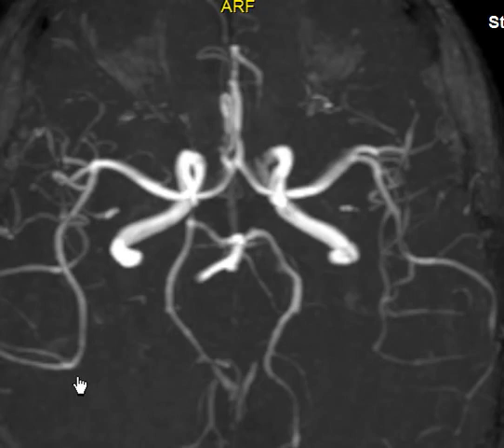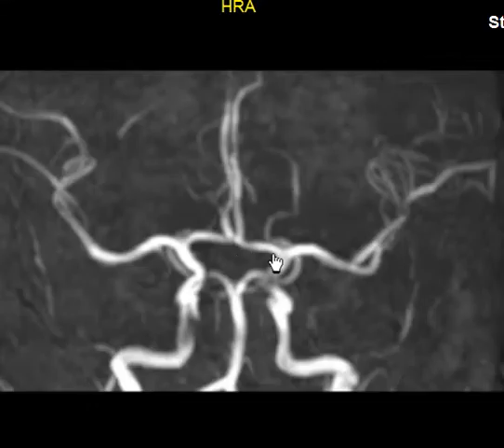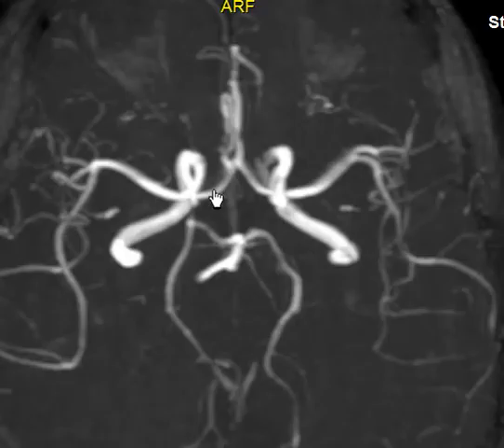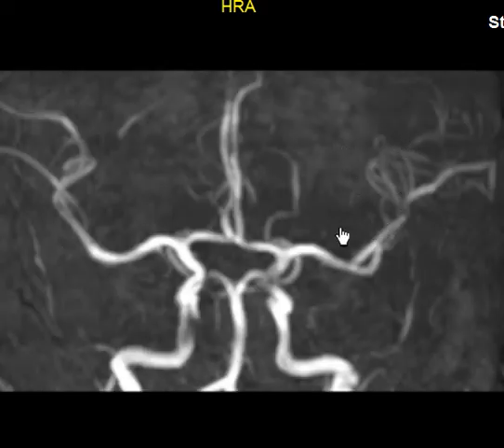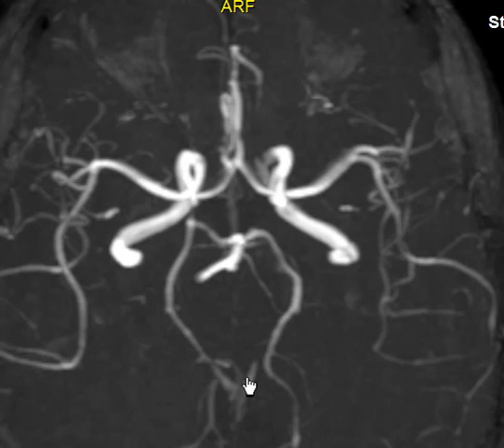Okay? While the ACA is also divided into A1, A2, and A3. The A1 is before the ACOM, anterior communicating. Then comes the A2, and the terminal branches are the A3 branches. Even the vertebral has segments. But as we said, these are just the end of the vertebral artery, so it's not very obvious. I will not comment on that because I don't have images. Okay.